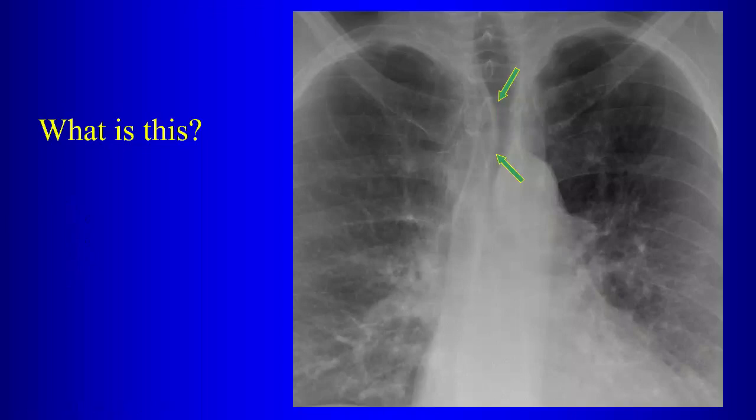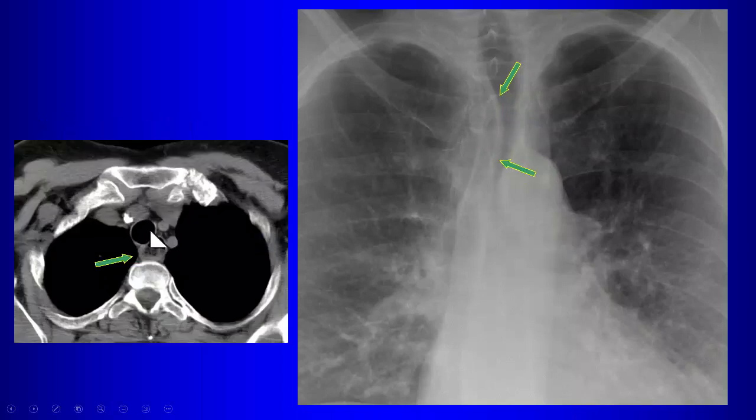Junction. No, wait, that's the pleuroesophageal line, correct. So if there's some air in the esophagus, you might see the right wall of the esophagus superimposed on the trachea. The right paratracheal line is here, a little bit further to the right. That is air in the esophagus outlining the right lateral wall. That is the pleuroesophageal line. So here's the esophagus; air in the esophagus outlines the right wall over the trachea on the chest radiograph. So don't let that fool you.